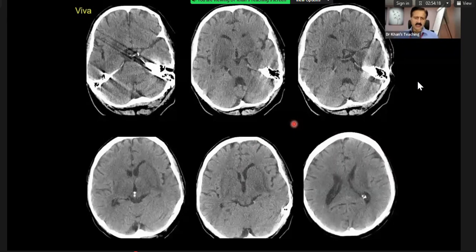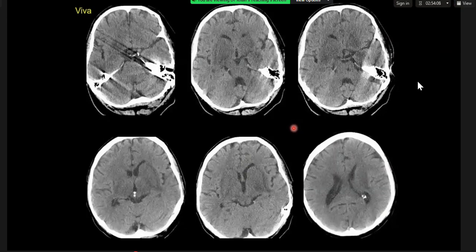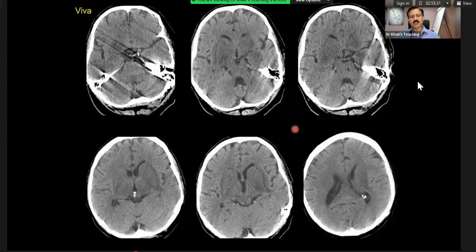So, just give me the findings, please. Candidate 1. Okay, so it's unenhanced CT head, and there is low attenuation change in the deep grey matter involving the thalami and basal ganglia. It's bilateral and has a symmetrical distribution. I can't see any associated mass effect or hemorrhage. So this would be in keeping with a deep grey matter abnormality, and again may represent ischemic or metabolic abnormalities or poisoning. Right. And poisoning should be up there.